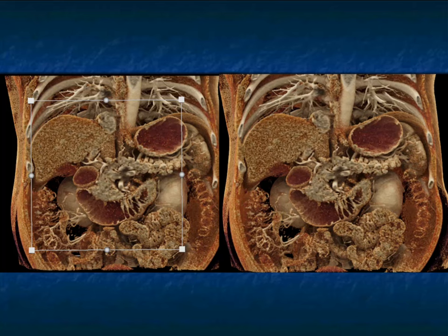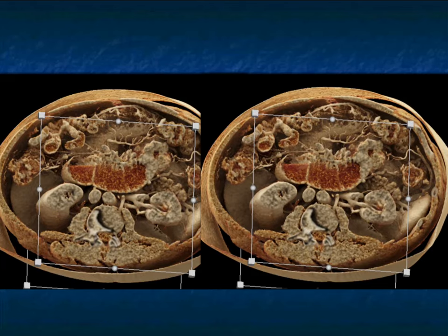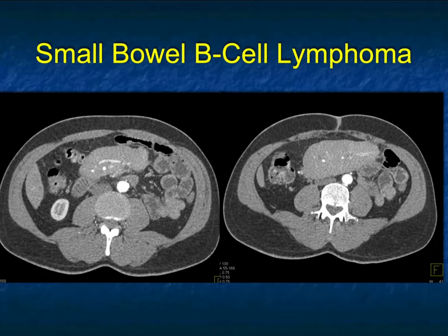Lymphoma is usually bulkier. GIST tumors are larger, typically exophytic. This is infiltrating, and carcinoma, primary small bowel adenocarcinoma, is the best diagnosis. Again, the transition point very nicely shown on the patient's cinematic rendering.